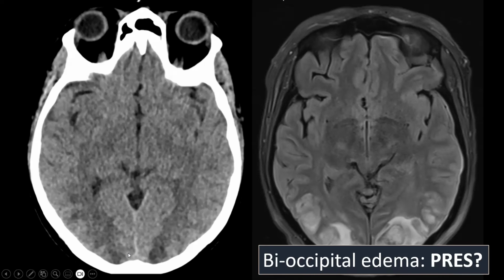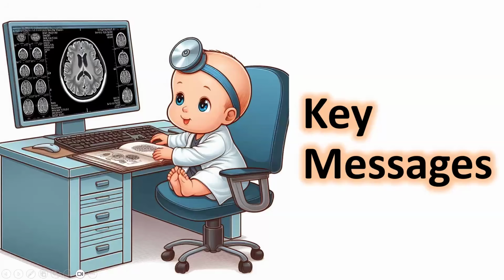So if you see a bioccipital edema and it's not an ischemic infarction, think PRES, especially if there's a clinical situation that would fit that diagnosis.